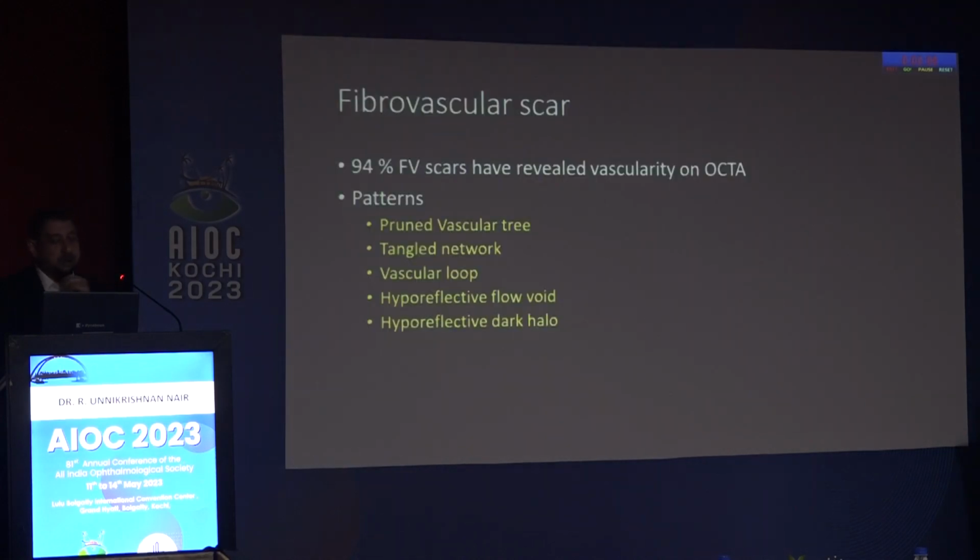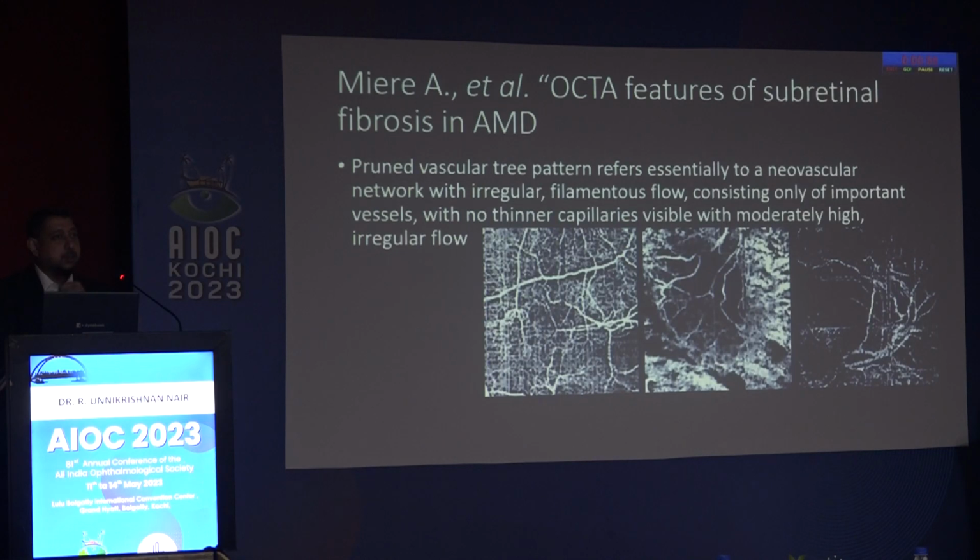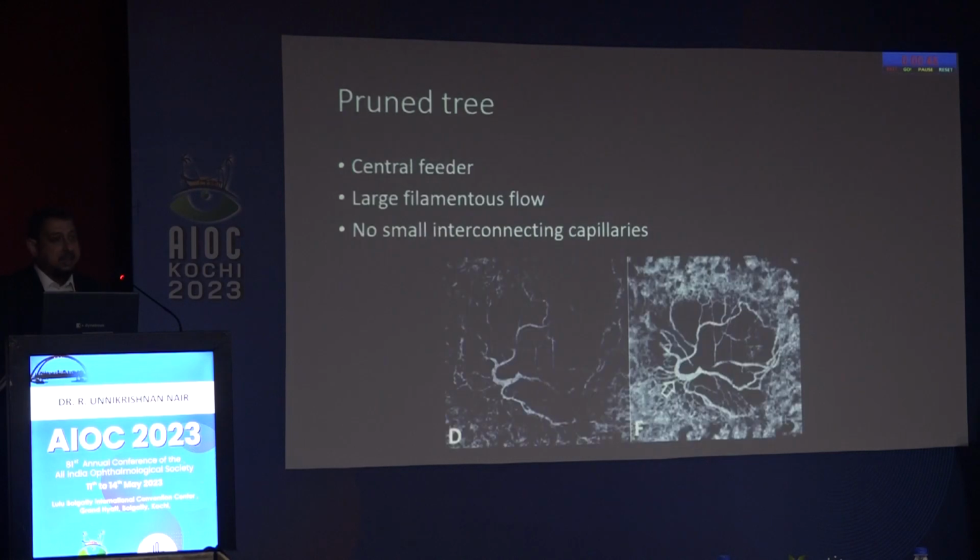The last part of the talk, which I'm limiting to AMD, is identifying scars. So in a scar, what we said about the fibrillary nature, a dead tree, a tree with no branches, this is the appearance of that. And this tells you, whatever we talked about before, there are no small branches, there are no peripheral lesions, it's just like a dead tree.